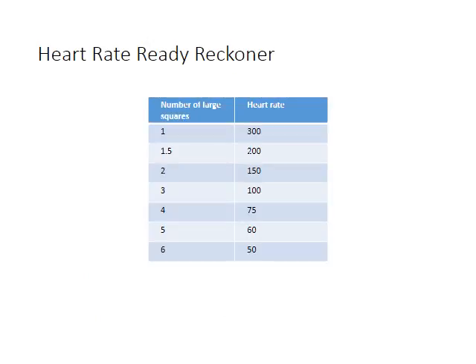You will see this ready reckoner system in some of the books. It's great for a quick, rough guide, but it's not accurate enough for this module and certainly should not be used when making formal assessments of the ECG.